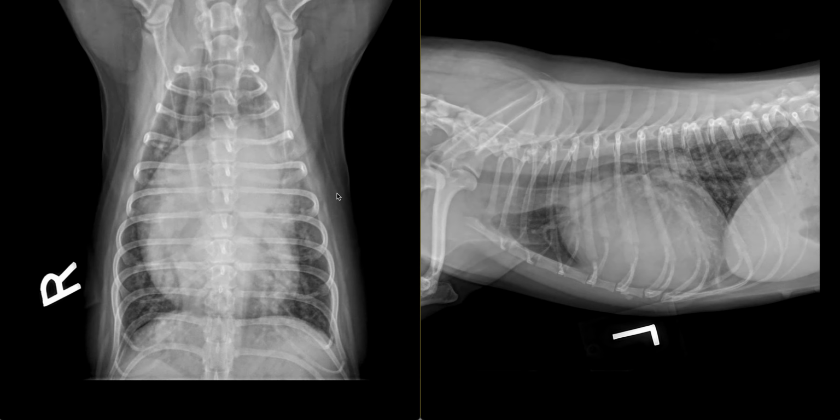There is a severe generalized hypervascular pattern with predominantly generalized increased diameter of the arteries relative to the corresponding veins. The arteries have a mild peripheral tortuosity.